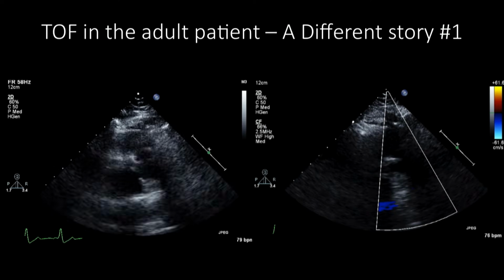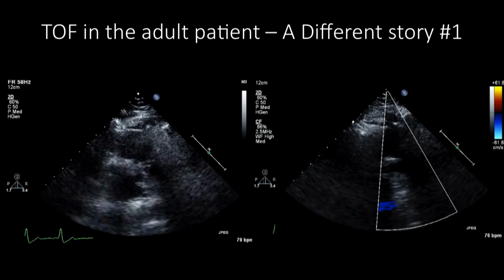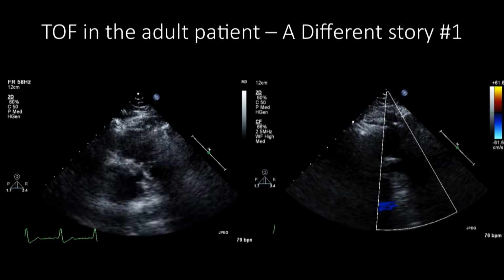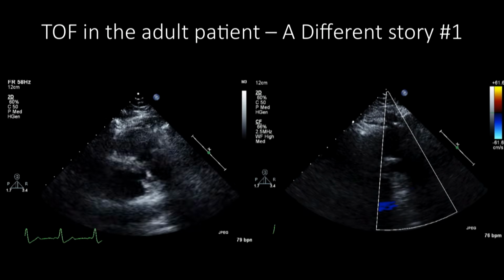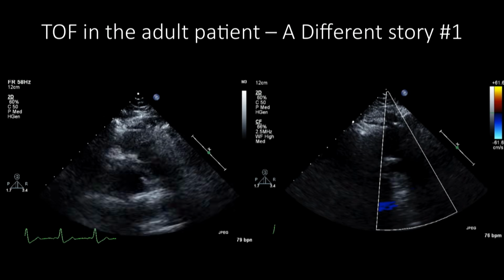It's just that it's very hard to get these good echocardiographic images in some adults because they have had sternotomies, and their body mass is much larger than our babies, and the pulmonary valve is more challenging to image. And in addition, it's the valve that we image the least in our clinical practice, in patients with other non-congenital conditions.